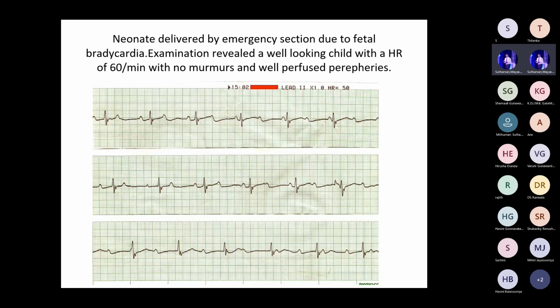Otherwise, you can't detect it, because at a glance somebody can say it's a sinus rhythm as well. In certain leads, if you only concentrate on those leads, you might think it's sinus rhythm, right? Somebody can think it's sinus rhythm right here, but see the P waves here, I'm keeping here, but the R wave here. So the RR intervals are much longer. The P waves are occurring in this manner, everywhere the same here, but the RR here is longer.